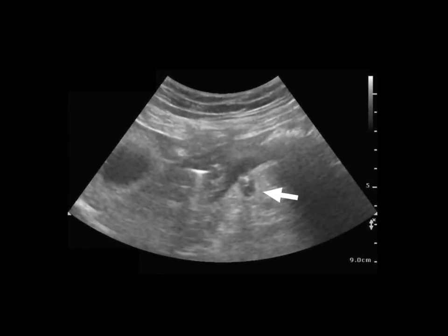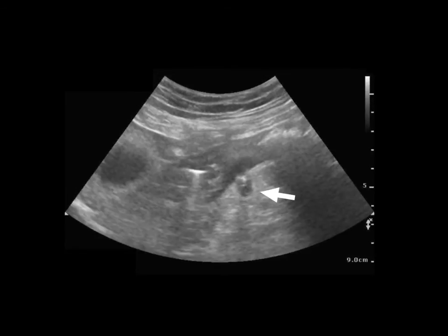Here's another still image with a curvilinear probe. Again, you have bowel here, and then coming down this grape-like structure of the diverticulum. Again, training your eye to look for this hyperechoic bright fat enhancement or fat stranding, because that's going to point you in the direction of the area of infection.